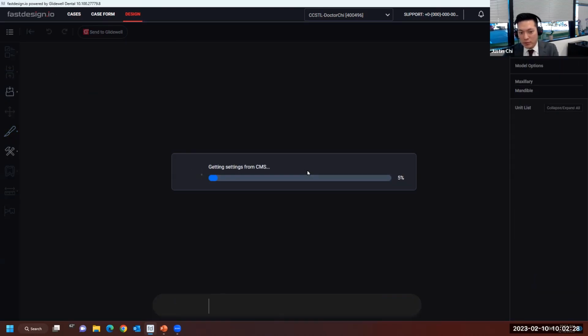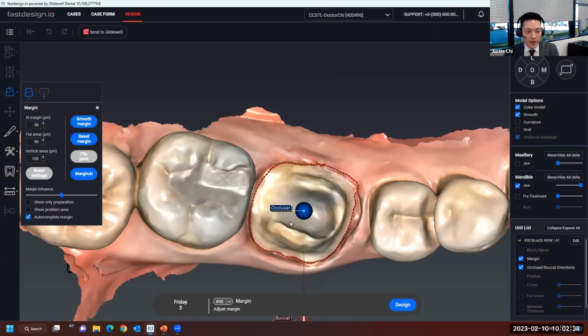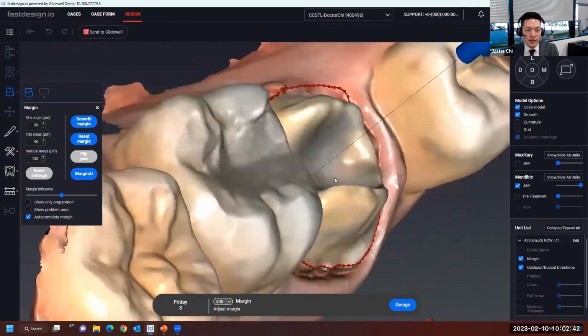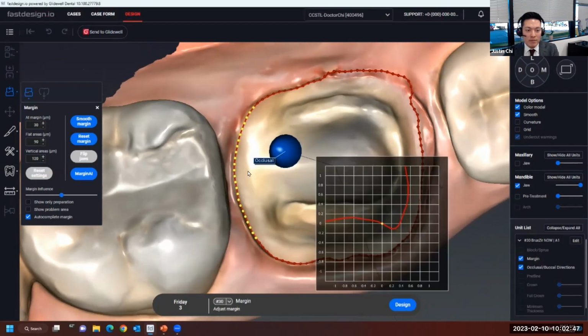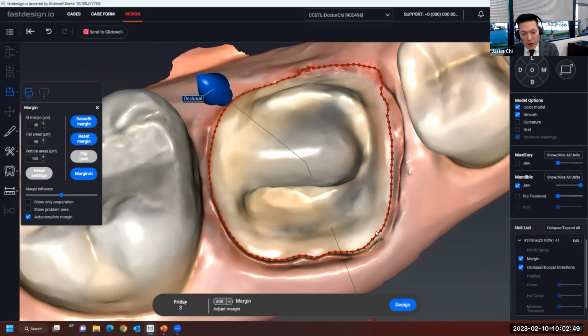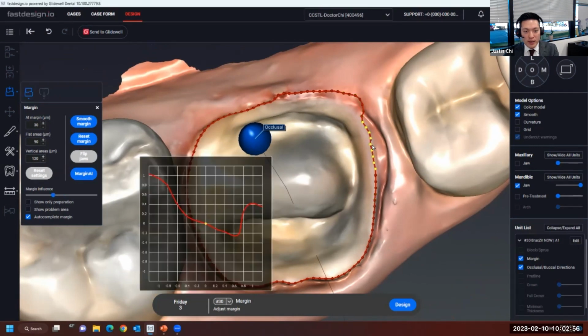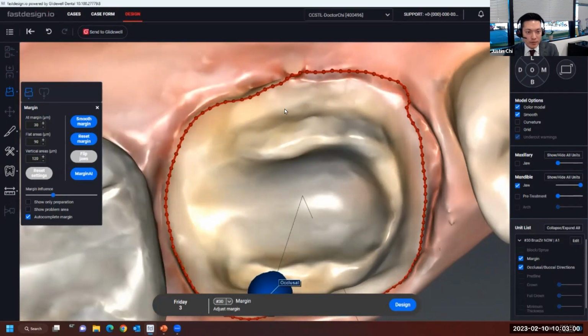All right, this one's going to be a little bit more interesting or challenging as far as the occlusal scheme goes because of, you'll see, the patient's occlusion. So here is the margin, and here you get a better visual of the space there. We could certainly build that up, and this is something we could discuss as far as doing a complete buildup, and this is one of the things that chairside mill users like to do in some cases, is mill the buildup with the restoration.